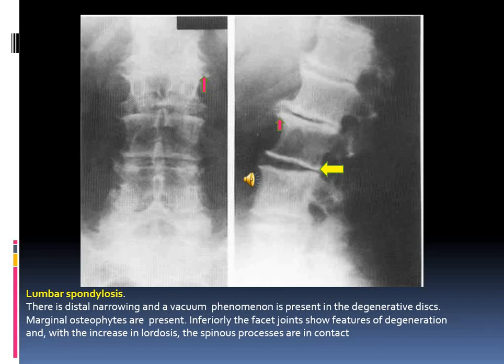If we look at the density of the vertebra, we see that the end plates of the vertebra are more dense than the body of the vertebra, and this represents degenerative spinal changes. Also, we can see prominent bones anteriorly, which are more prominent in the lateral X-ray. This is called osteophytes, and they are marked by the red color in both views. So this represents the osteophytes.